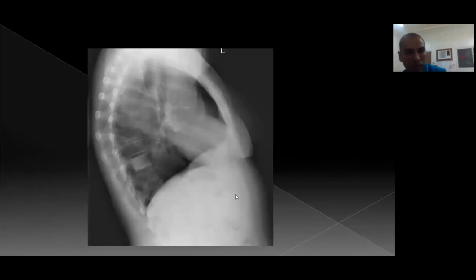This one is a chest X-ray, lateral view; you should also see the sternum. It's clear. Manubrium sterni and sternal body, clear. The vertebral body, no wedging, but we have here a sclerotic vertebral body in the dorsal spine, maybe metastatic, maybe something like this. It needs further assessment.